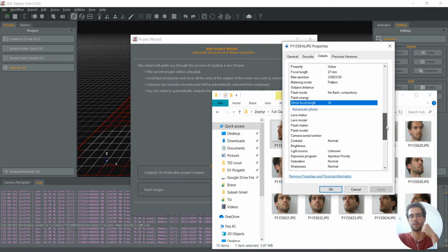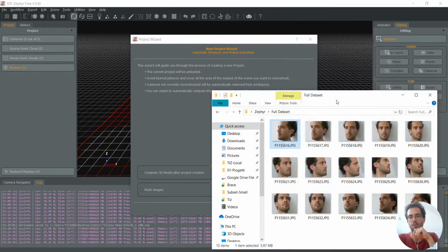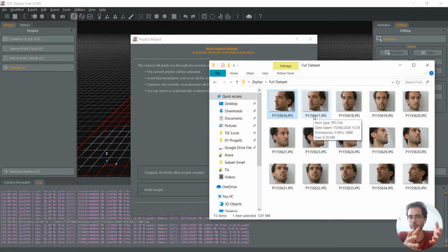That part is really needed because to get a proper scan with photogrammetry, you need to correct all the data present in the image for distortion, so that the data in the photo is actually metrically correct.